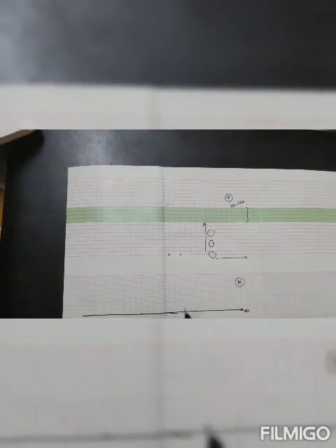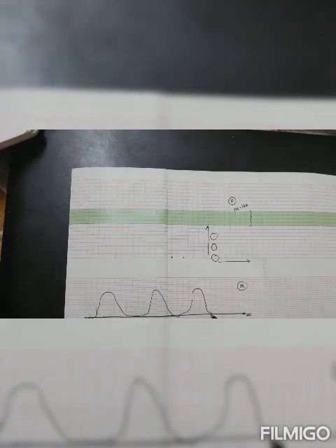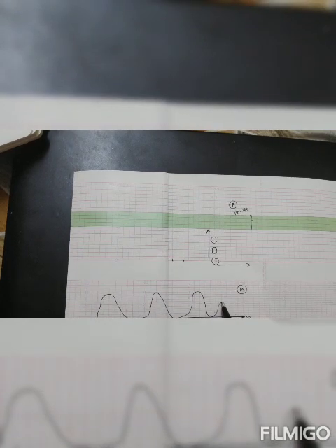Coming to maternal part, it will record the maternal uterine contractions. Usually Toco probe will be fixed to 20. Number of contractions can be calculated. The strength of the contraction is not important in CTG. It is the number of contractions which is important.